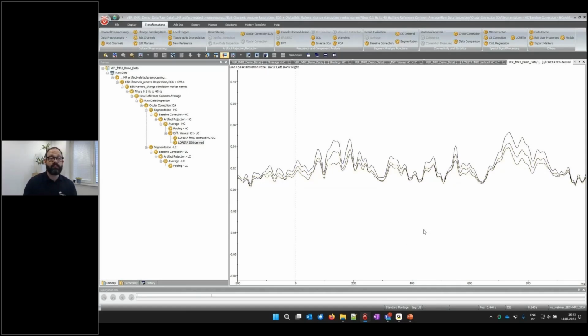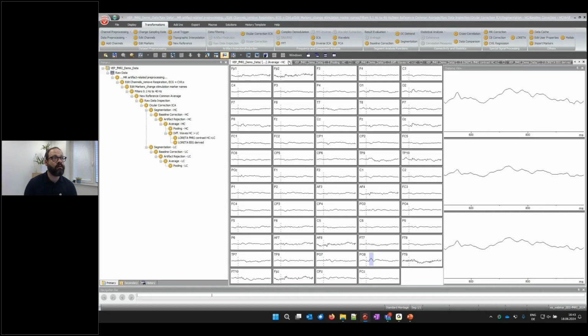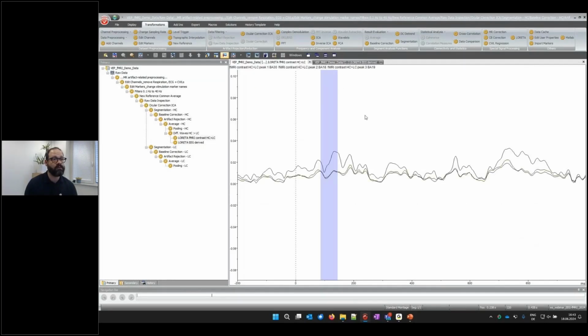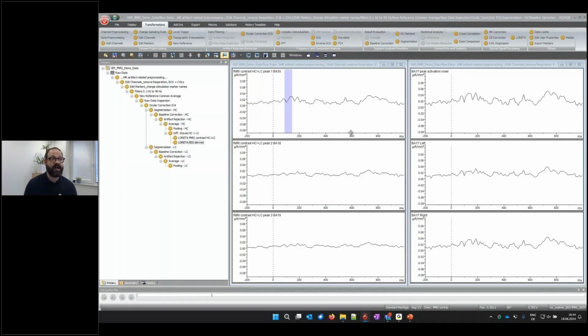Okay, so let's now do the following. I'm actually switching here back to the grid view, and I'm closing now my other nodes here and just keep open my 2 LORETA nodes. Also here I switch back to the grid view. And now I have only these 2 open, and I will use this different visualization to tile my windows vertically, which is a nice way here of comparing them left to right. So now here on the left side, those are the time series extracted from the fMRI. Those are the ones from the EEG.